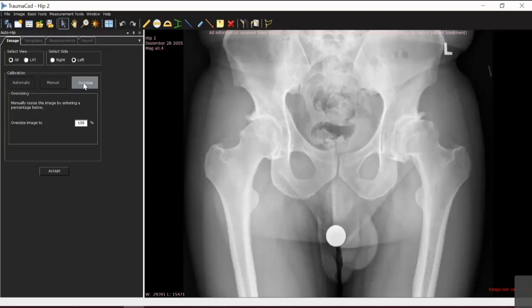So you may allow 10% magnification in that case. If it's a large patient, and even if you hadn't seen that patient, you can tell from the X-ray the amount of adipose tissue. So you could glean from that this is a larger patient. So you may allow 25% or even 30% magnification.